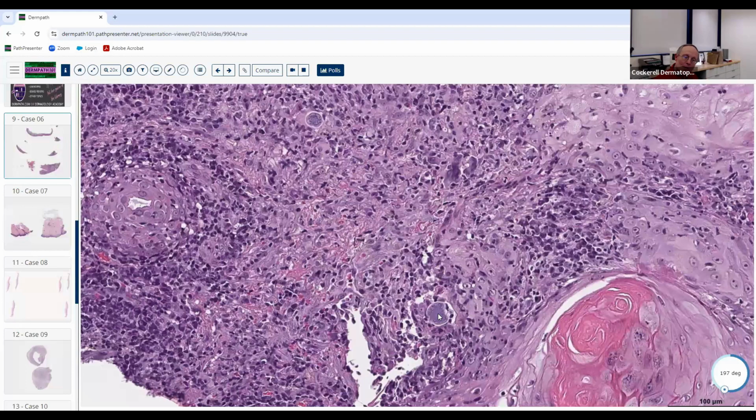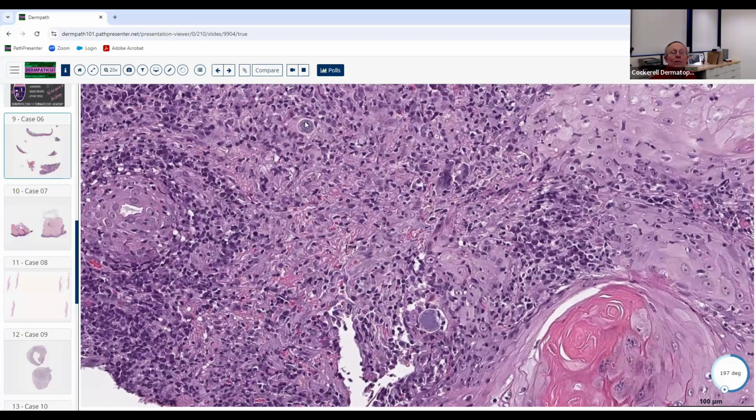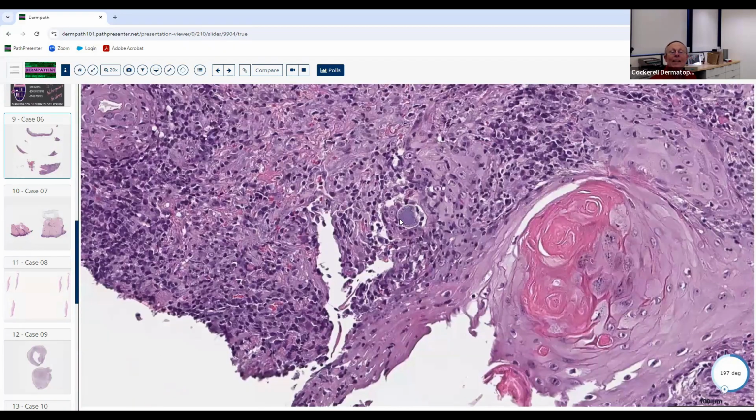Some people used to think that they were fungi, but genetic studies show they're closer to parasites. They're kind of like the eggs in Alien. The spherules, the intracellular organisms, are much larger than these tiny little spores inside these. So they don't look anything like this.